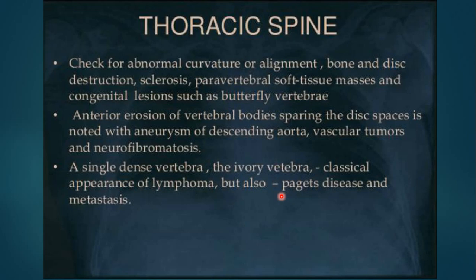If you see the disc space is eroded or involved, then think of infective causes and abscesses and bacterial infection, like for example TB of the vertebrae.